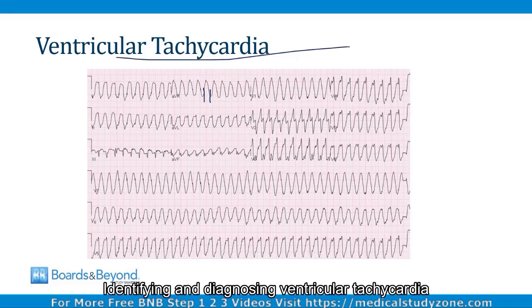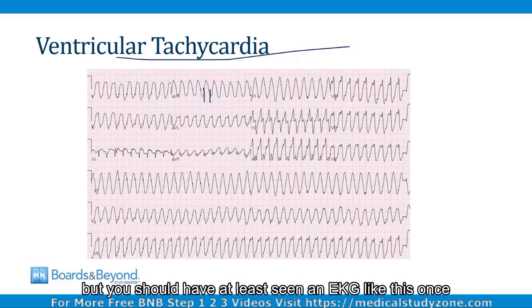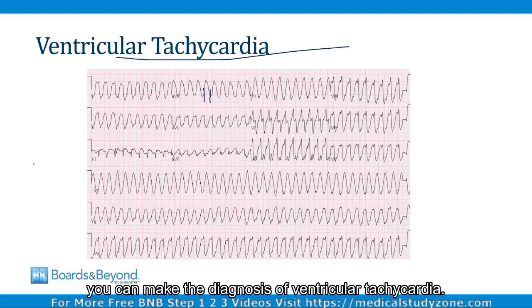Identifying and diagnosing ventricular tachycardia is a very advanced concept. It's something cardiology fellows learn to do. You don't need to know it at the med student level, but you should have at least seen an EKG like this once, because often simply by pattern recognition you can make the diagnosis of ventricular tachycardia.